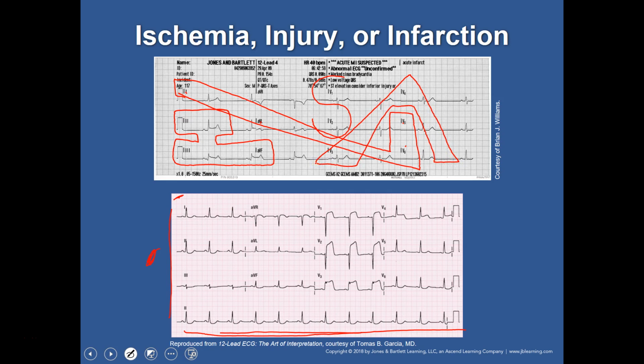And then our A for anterior. I'm just going to make a quick little mark here. Lateral, inferior, septal, and anterior. That's what we're talking about, kids. So let's go ahead and look at this one. We can start however you like. I like to just go ahead and start at the beginning.